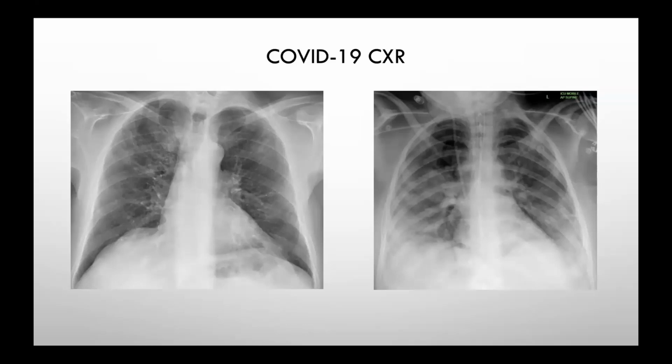And then the last one is probably when he or she is approaching more severe disease, and you can see some air bronchograms forming, especially in that right mid zone. There's a nice clear air bronchogram. It's forming more consolidative disease. I suspect this patient has some bacterial superinfection as well, but it's clearly much more aggressive disease. But the chest X-rays highlight how variable COVID can present on a chest X-ray.